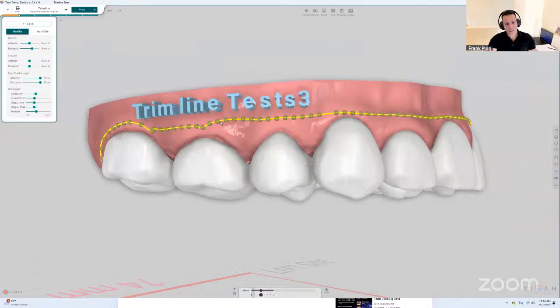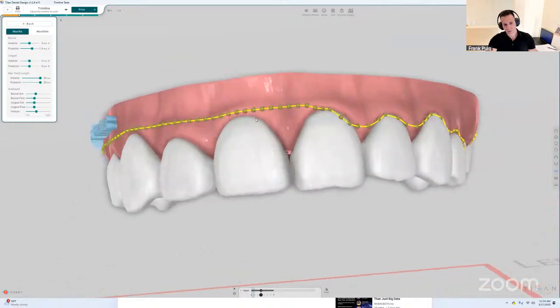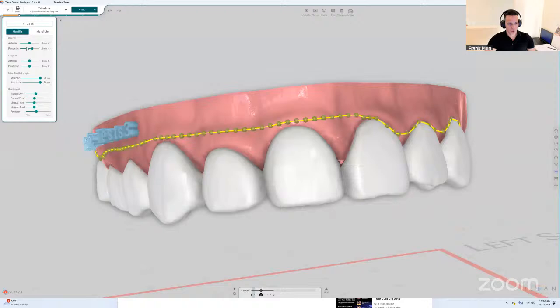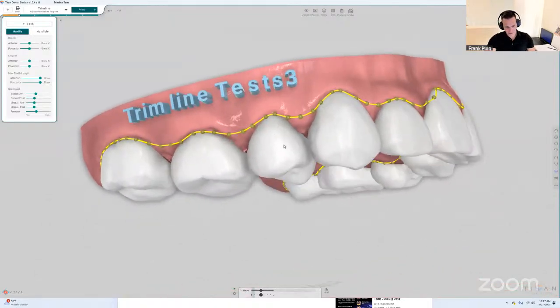Once you do this, the spline over here is calculated automatically, but over here it is using whatever you pinned to the surface. So if you want to reset these changes, you just change any slider, like here, and it will revert every point that you adjusted to the new settings. So that's an easy way to revert everything.